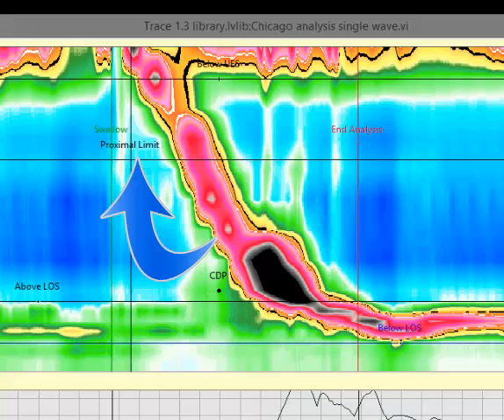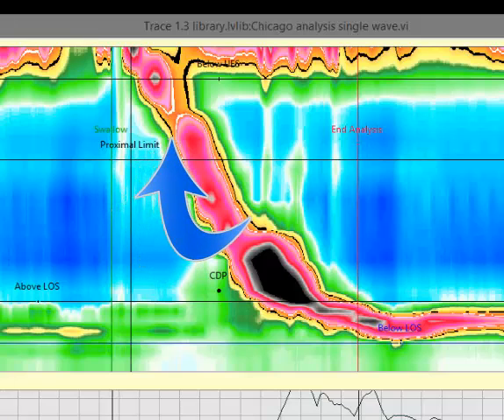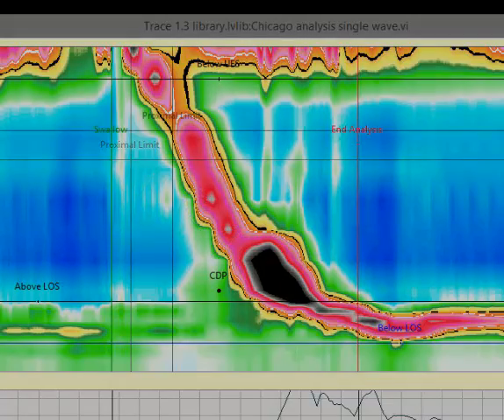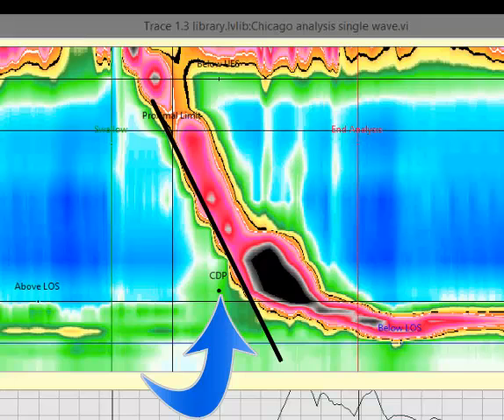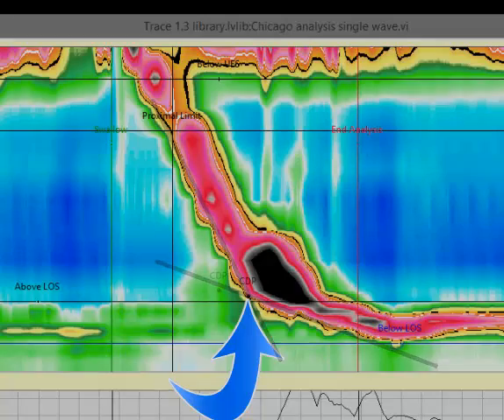Move the proximal limit cursor to the earliest point of the 30 mm of mercury contour in the lower segment of the esophagus. This will be used to define the beginning and proximal extent of the DCI and the upper point for the calculation of the contraction front velocity. Move the cursor labelled CDP to the point of intersection of the tangents of the contraction front and the slower contraction of the phrenic ampulla on the 30 mm of mercury contour.